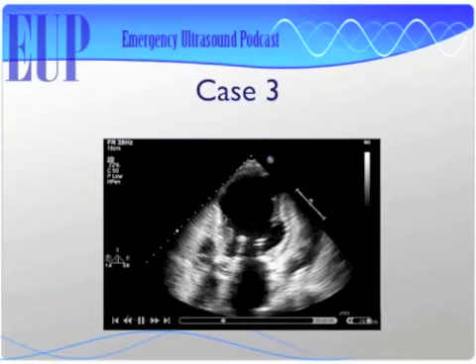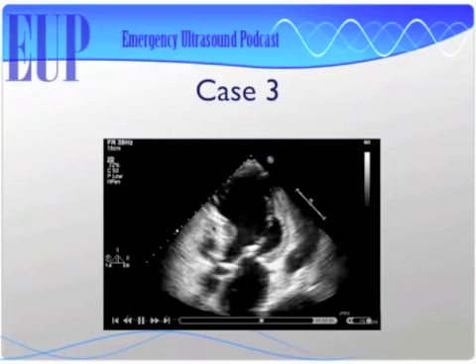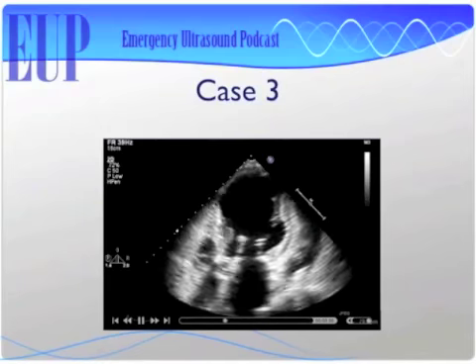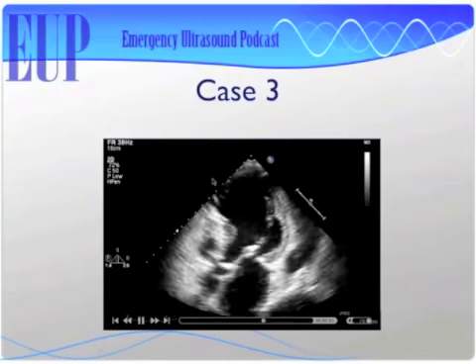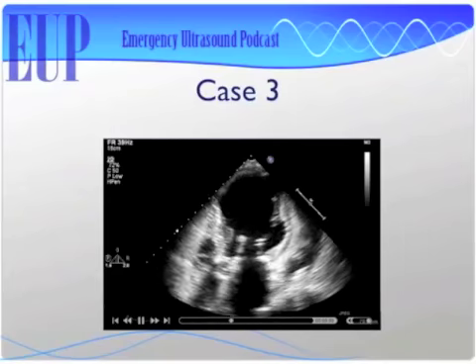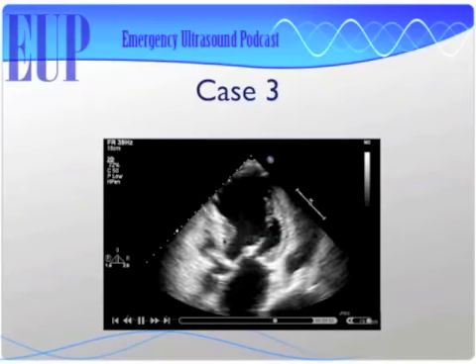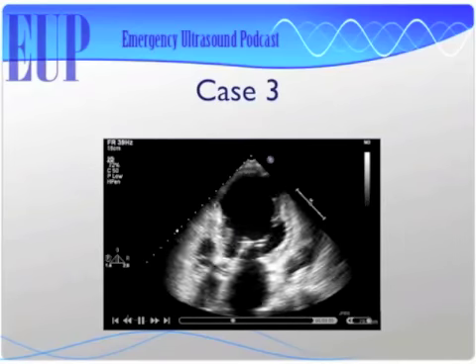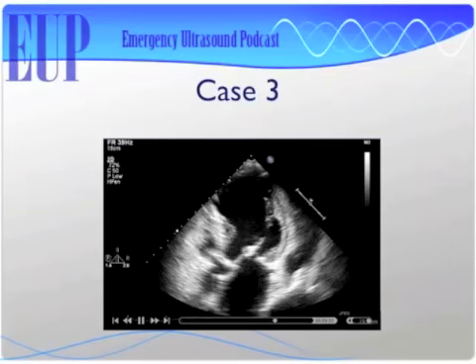So tell me, Matt, why would this part of the LAD distribution work okay, but this part would not? Because it's more distal occlusion. Perfect. Yeah, actually, that's an awesome answer. So basically, you've got a distal occlusion of the LAD, so it's occluded far enough down that you're getting blood flow to the proximal septum here.